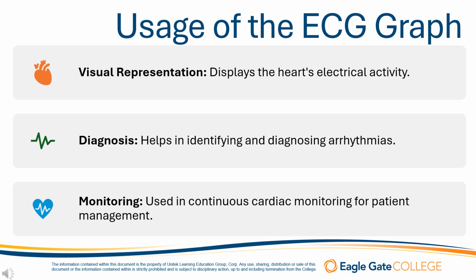It can verify that there's appropriate pacing and capture, ensuring that the pacemaker is correctly regulating the heart's rhythm. Any abnormal pacemaker spikes or failure to capture can be identified and addressed promptly.